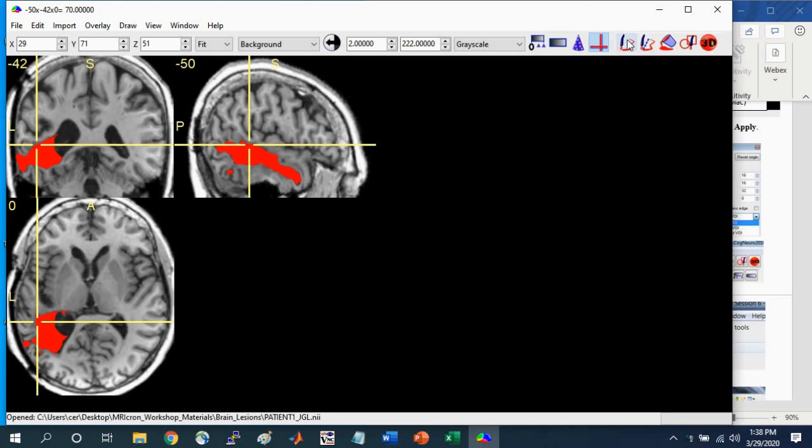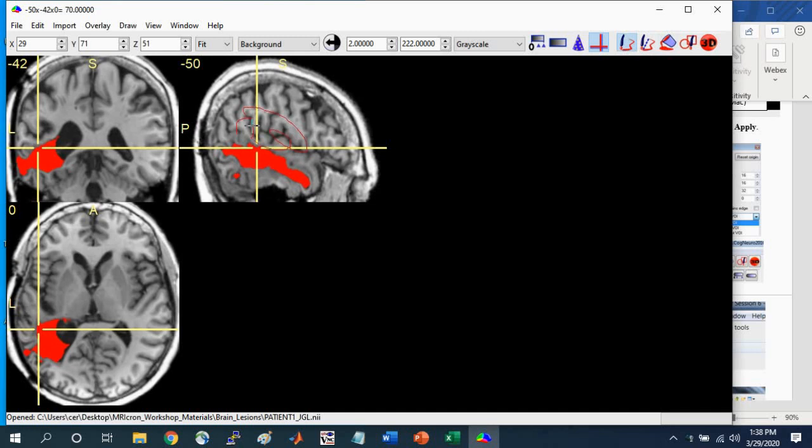Okay, the last thing I want to point out about drawing lesions are these other tools. Here you can see this pen tool up in the upper right. If you select this tool, you can draw, right? But it only draws in 2 dimensions, so I tend not to use it. You can go through these and try out these other tools, but for the most part, using them to draw lesions is very time consuming, and I would not recommend them. I would recommend getting used to using the 3D bubble tool and only using it. Otherwise, it can get much more time consuming.